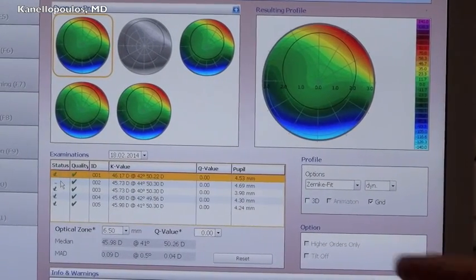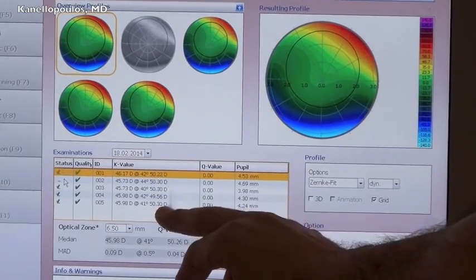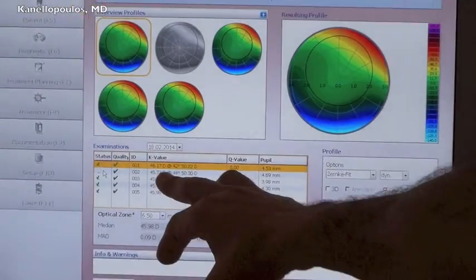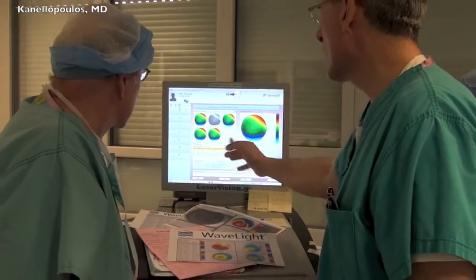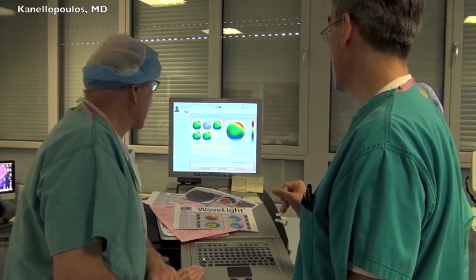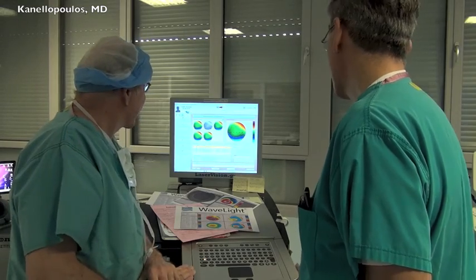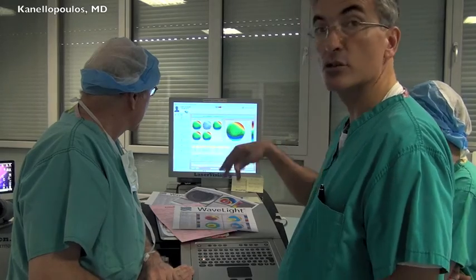George brings up a very good point. We usually go by the axis of the steep or the flat axis. If one of the axes of these pictures is way off, we'll try to take that one out. Or, as Vasco mentioned, if the keratometry is much different in one of them, or if qualitatively one of the pictures looks a little bit funnier. But in this case, the pictures all look the same, more or less, so you went by the numbers. Right. That was good. This is one of the rare occasions that we have 3 Pentacams and their interdeviation is 0.